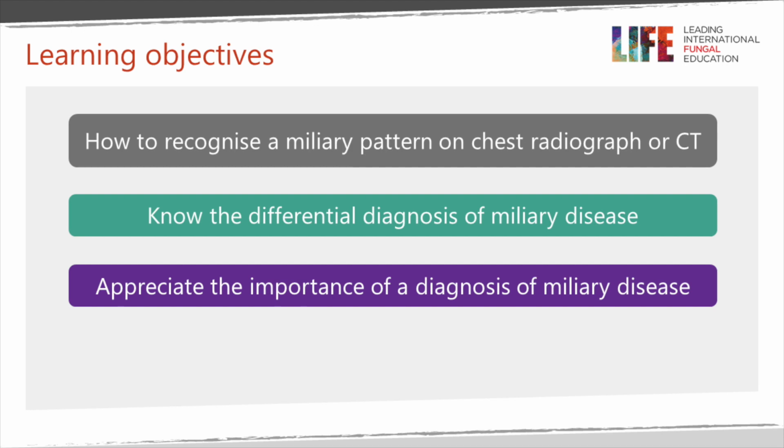So the main objectives are how to recognise both on radiographs and on a CT scan when the pattern is miliary, the differential diagnosis of both miliary disease and also other pulmonary nodules, and I want you to be aware that miliary tuberculosis is an extremely serious disease and needs prompt management.